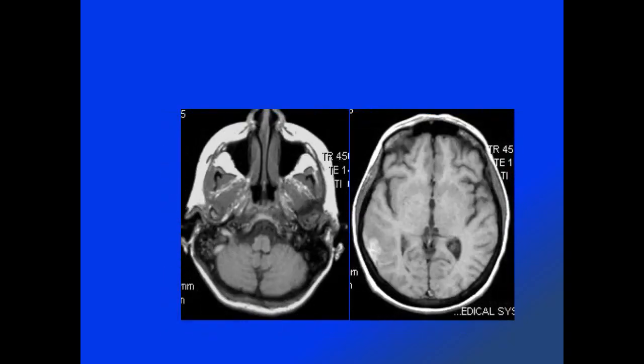On these T1-weighted images, they again demonstrate an area of opacification of the right mastoid, and these areas of T1 hyperintensity in the region of the right sigmoid sinus and right jugular fossa, and higher up in the right posterior temporal lobe, an irregular area of precontrast T1 hyperintensity.